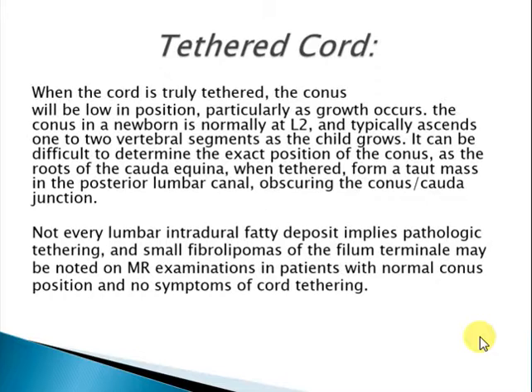Not every lumbar intradural fatty deposit implies a pathologic tethering. Sometimes there are small fibrolipomas of the filum terminale. They are seen attached to the filum terminale. They are incidental findings. As the name implies, they have fat content, and there will be no symptoms of cord tethering, so we should keep that in mind.